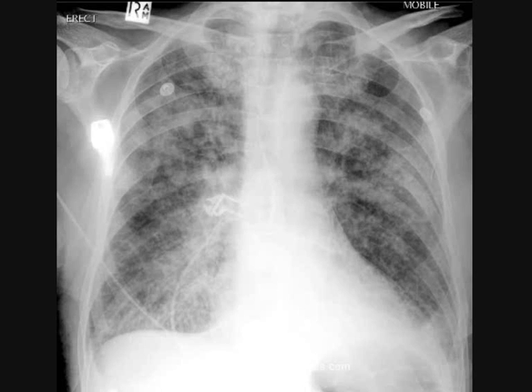Most common causes of cardiogenic pulmonary edema are left ventricular failure and mitral valve stenosis. Left ventricular failure, for example, because of myocardial infarction, i.e. heart attack, or mitral valve stenosis, leads to obstruction to flow of blood from the left atrium to the left ventricle, and hence increases pulmonary venous pressure.